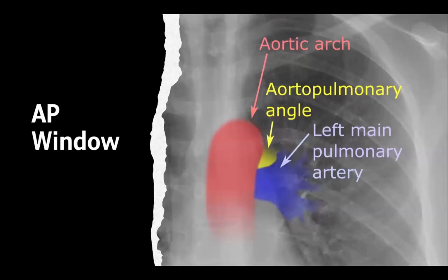Let's move now to another structure, which is the AP window. I really find it important to always look at it, particularly when the clinician is asking about lymph node enlargement and lymphoma, especially in the pediatric age group, where lymphoma can present as lymph nodes and sometimes it's a really subtle abnormality. The only thing is that there is an obscuration or obliteration of the AP window because of one of the most common reasons, which is lymph nodes.